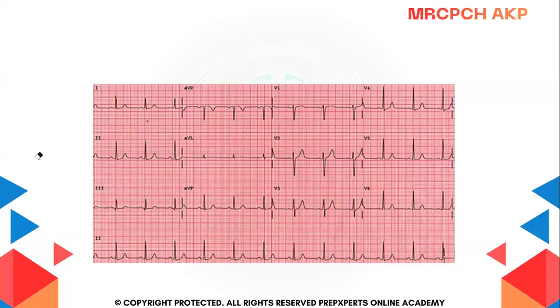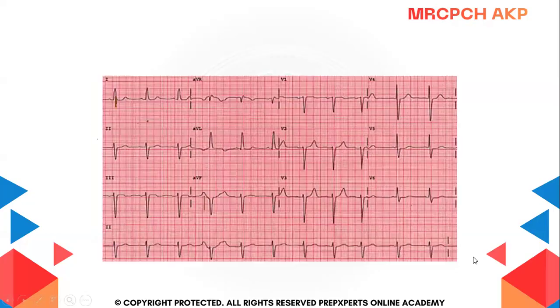So everybody got the idea. That's great. Let's move forward. Okay, so which axis is present in this ECG? Just look at the lead one, raise your thumbs, and then decide. I'm not going to help you in this one.